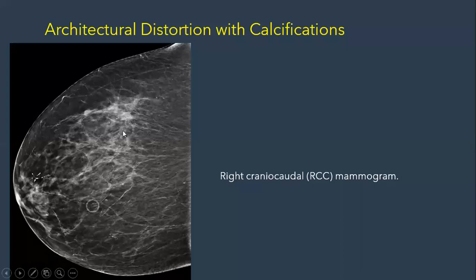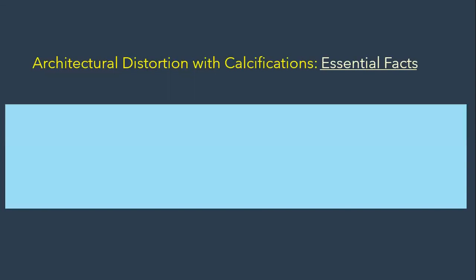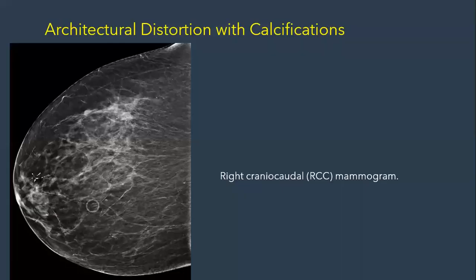I think this is an architectural distortion. Okay, the right CC view demonstrates architectural distortion, and even associated calcifications, distortion with foci of calcification.